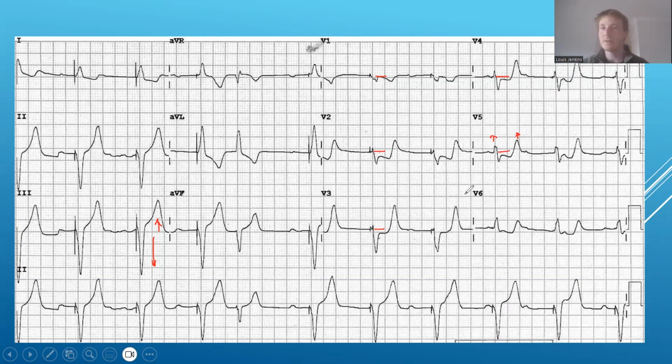So if we're going by the Barcelona algorithm, this patient would be positive at this point and we would be concerned about an OMI, particularly with the history that this patient has of ACS-like symptoms, okay? And again, we have some concordance here and a little bit of ST depression in V6 as well. Okay, so let's revisit lead V2 for a second.